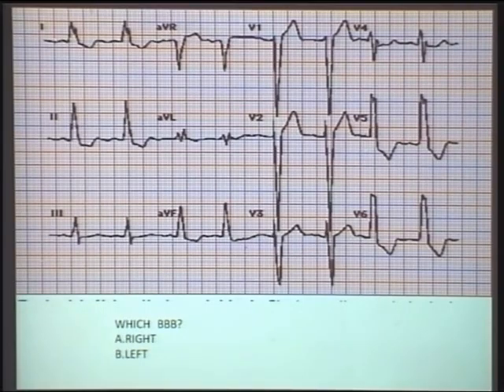So you can see that the QRS is widened. Then see the terminal delayed slurred positivity. The right side leads have the negativity in the terminal complex, so it cannot be a right bundle branch block. The terminal vector is coming towards the left and it is slurred. So there is terminal delayed slurred positivity in the left side leads, with the classical secondary ST-T changes there. So it's a classical left bundle branch block.